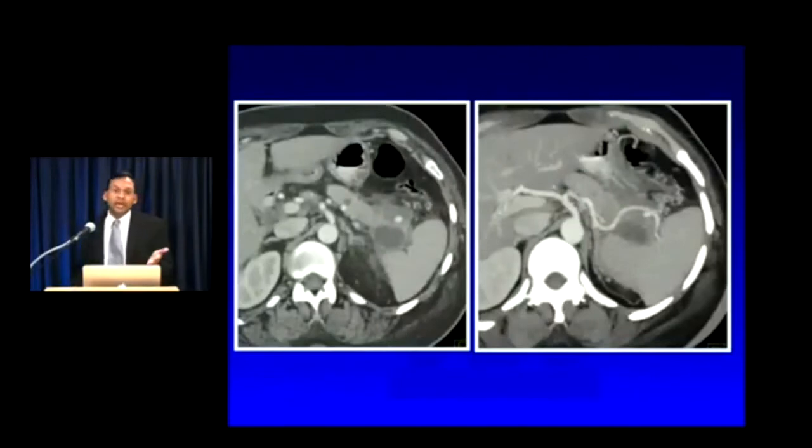Now, this is where you want to catch it, right? This patient has a subcentimeter pseudoaneurysm. There's a small amount of hematoma, so it's certainly on the verge of rupturing. This patient ended up going to angio, did fine, no problems.